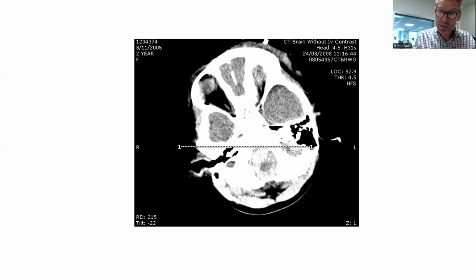Sometimes you get bleeding within the brain itself. And in this scan, it's again a horizontal projection at a low level, because what you can see is the temporal lobes here, the grey parts laterally are the temporal lobes, and these are the frontal lobes coming into view. Right, so just above the sinuses. These are the nasal sinuses, and it's above the sinuses. You can just see the frontal lobes. And this here posteriorly is the lower part of the cerebellum and the upper part of the brainstem.